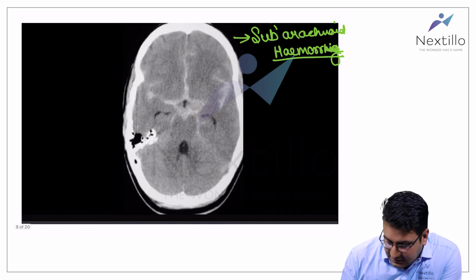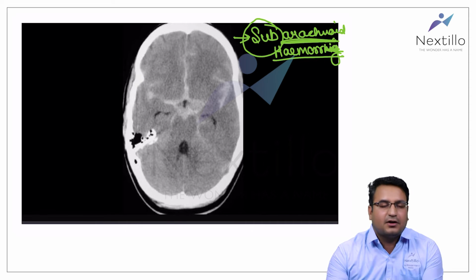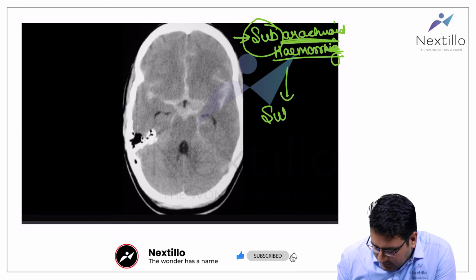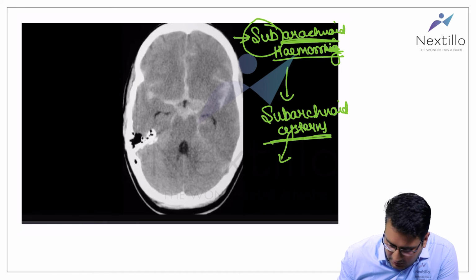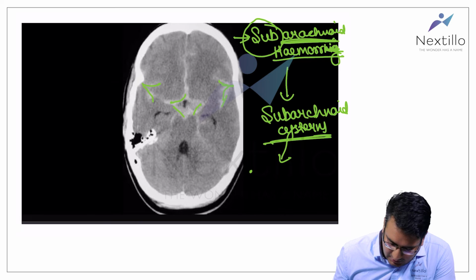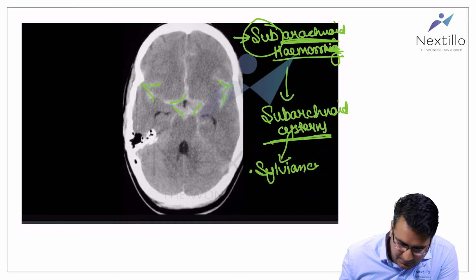So as the name suggests, it's beneath the arachnoid layer. So what is subarachnoid space? Beneath the arachnoid layer, there is a subarachnoid space, which contains CSF. So there are subarachnoid cisterns in which blood is going to get accumulated. What we are looking at here, these are the cisterns. Okay, have a look. These are the cisterns. A few examples of subarachnoid cisterns could be asked. Sylvian cistern. Okay.